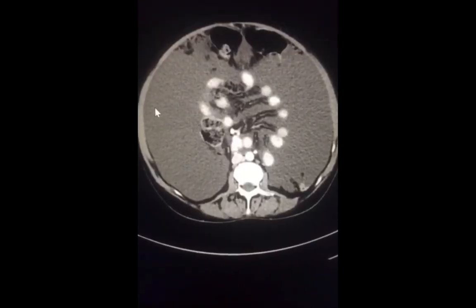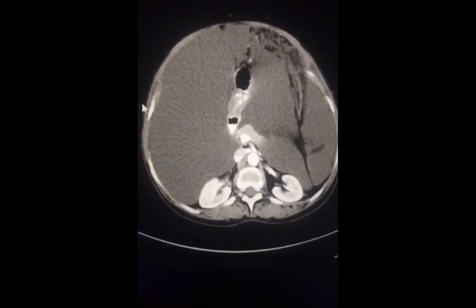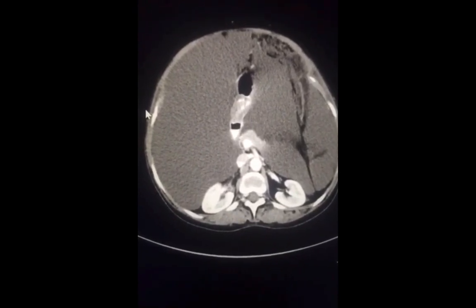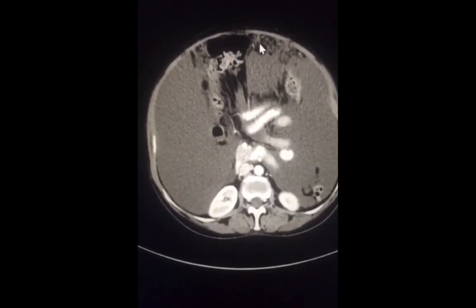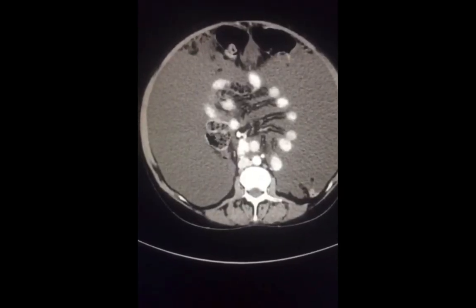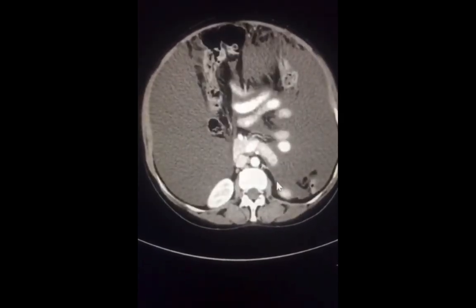Another thing that you'd look for, which is absent here, is obvious thickening of the peritoneum. And whenever you're thinking about malignancy, you have to look carefully at the mesentery and the omentum. To simplify the omentum, it's a folded layer that's located anteriorly and composed of fat. Fat should be similar to subcutaneous fat here, so the omentum should have clean fat. And if you look carefully, this is not the case here.